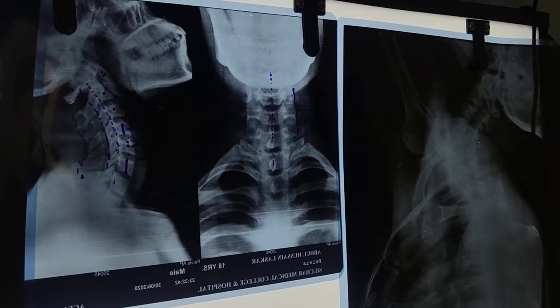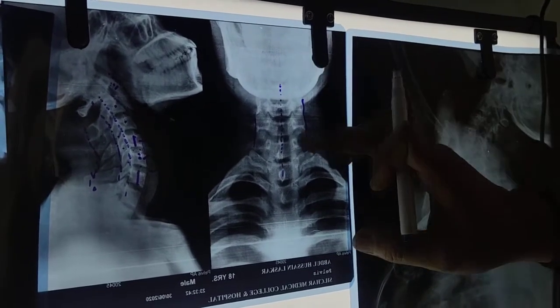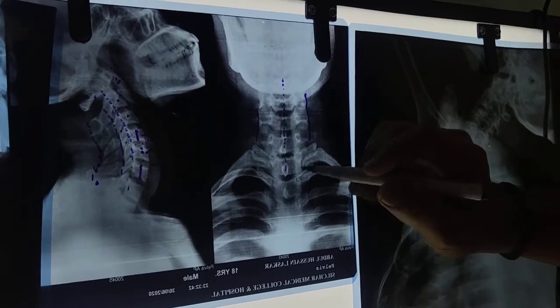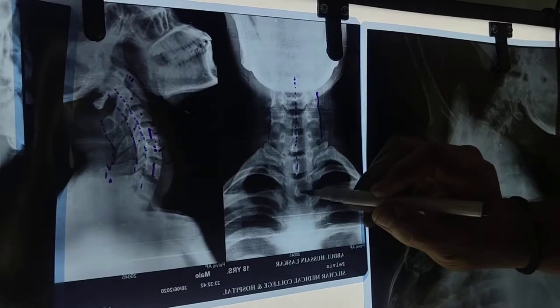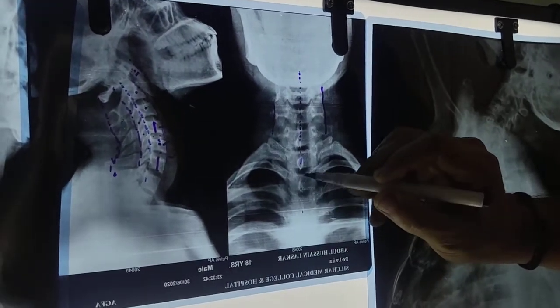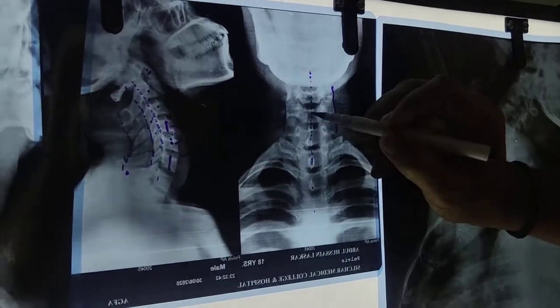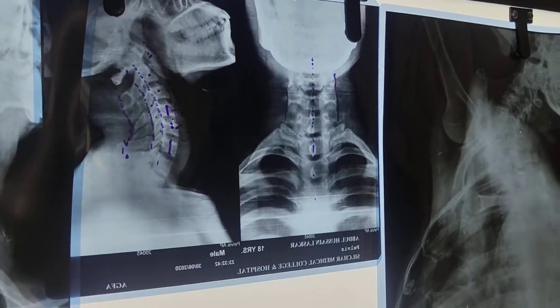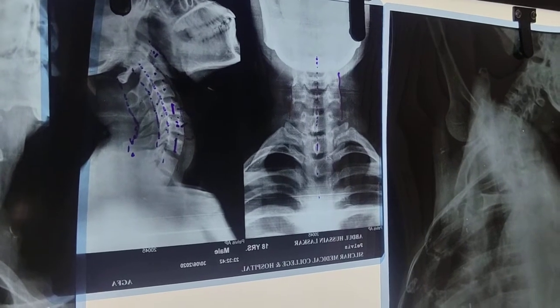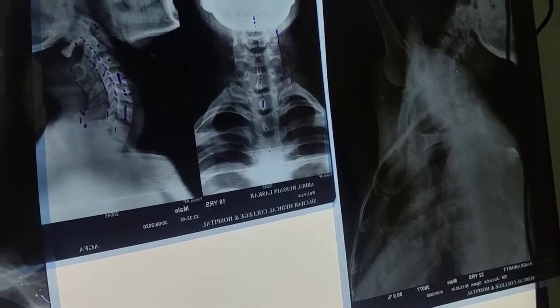This rotation of the vertebra will be reflected in the AP view of the cervical spine as a distortion of the central line. The central line in the AP view should be continuous, like this it is continuous. Suddenly if it disappears and goes like this, it is not continuous, which indicates evidence of unilateral dislocation of the vertebral joint. Got my point?